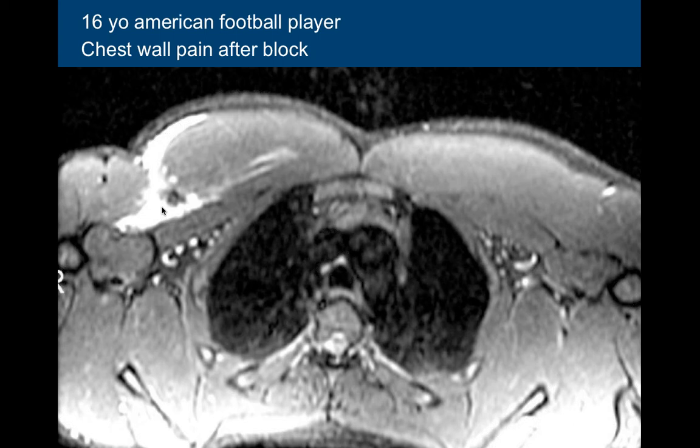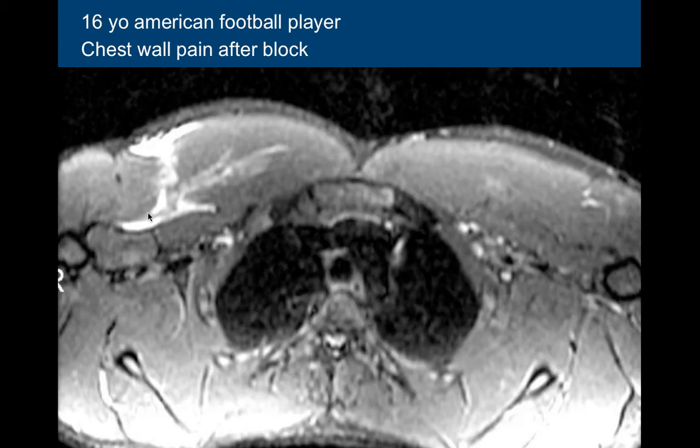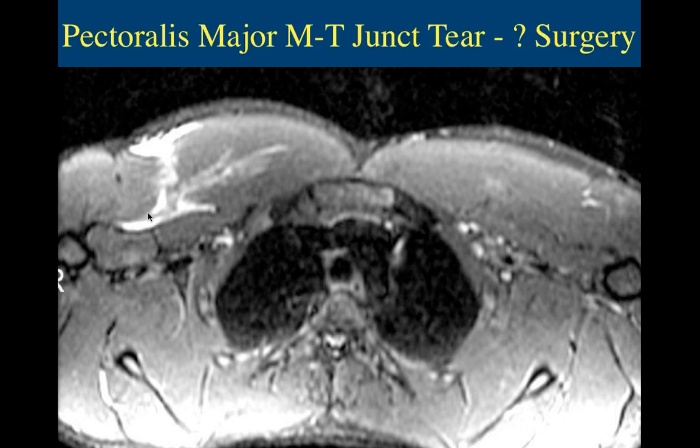And actually, I'll try to follow up next week to see how he's doing right now. I believe this was just about 6 weeks ago, but I believe that the decision was made to treat this person conservatively. I have no quarrel with that. If you can go up and down in terms of acquisitions and see how broad that tendon is. If you have only one cut, I would treat it conservatively. Okay. See, and that's the next cut, and there's just that one cut that we could see a nub of tissue there.